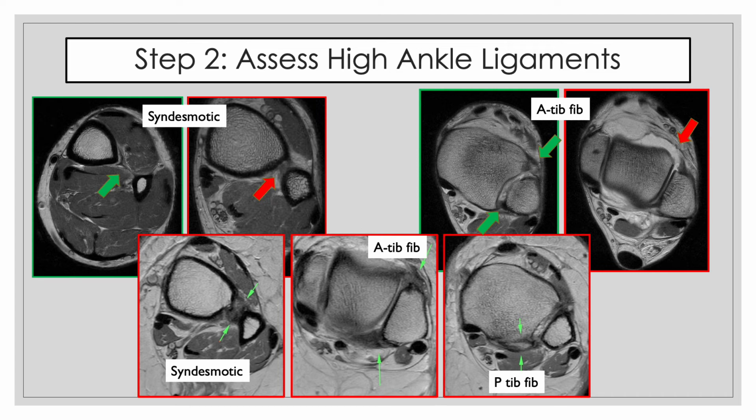And then last but not least, you have a bony avulsion from the posterior malleolus of the tibia with a posterior tibiofibular ligament injury. And when you have a bony avulsion that is sizable, then that's usually a reason that people want to fix those or put screws through the posterior malleolus as well. Okay. So again, high ankle injury means that somebody has a greater likelihood to head towards surgery. And if they do a surgery, the question is always whether they're going to just do a surgery that involves the fracture fragments, or they're going to have to put a syndesmotic screw in as well.